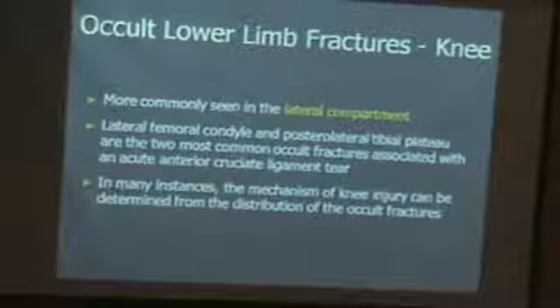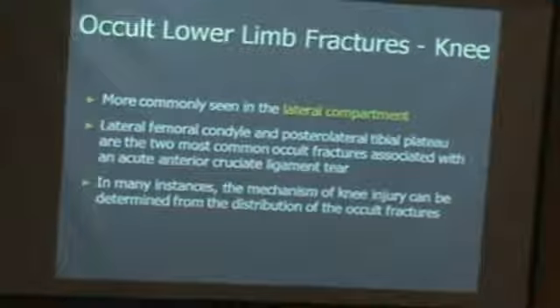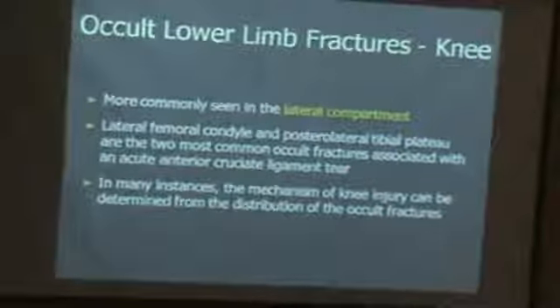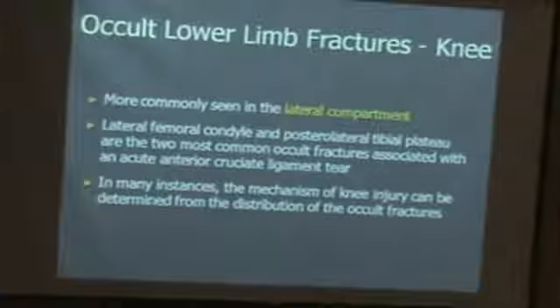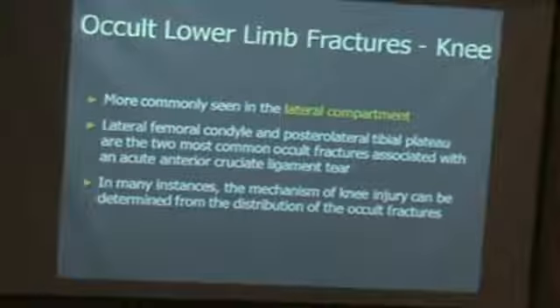I'm going to just repeat this, because when you look at the images, you look at the T2, proton density, fat saturated or non-fat saturated, very well. Why that? Because it gives you all the information: on the cruciate ligaments, on the collateral ligaments, on the menisci, on the bone marrow.